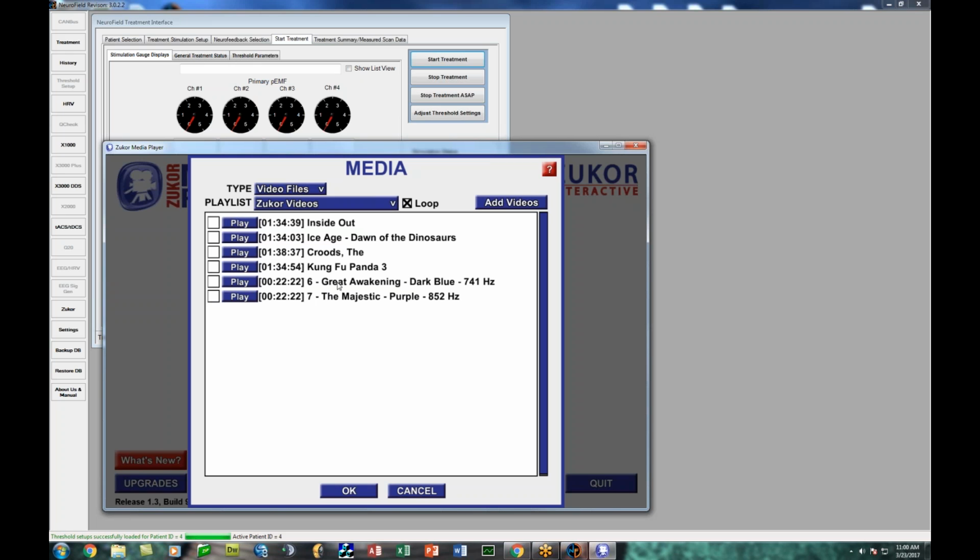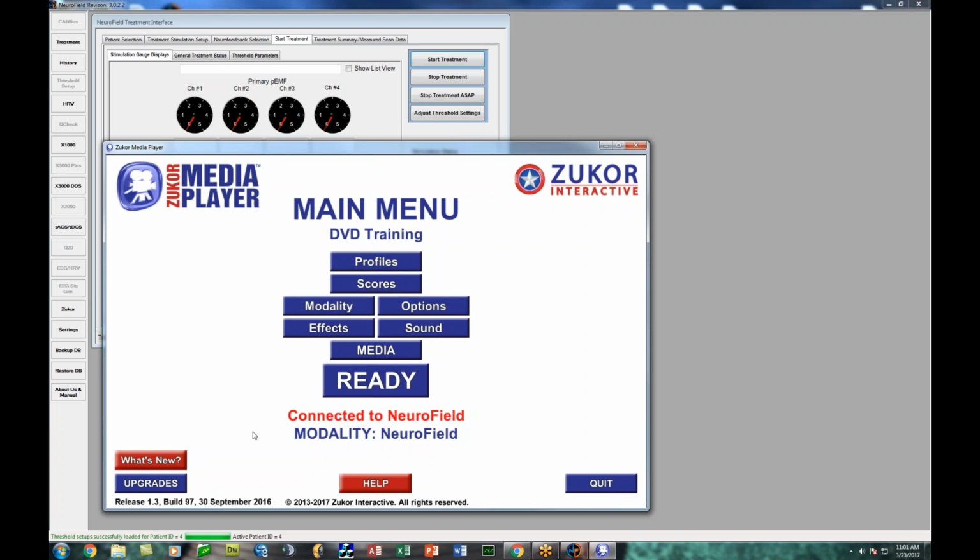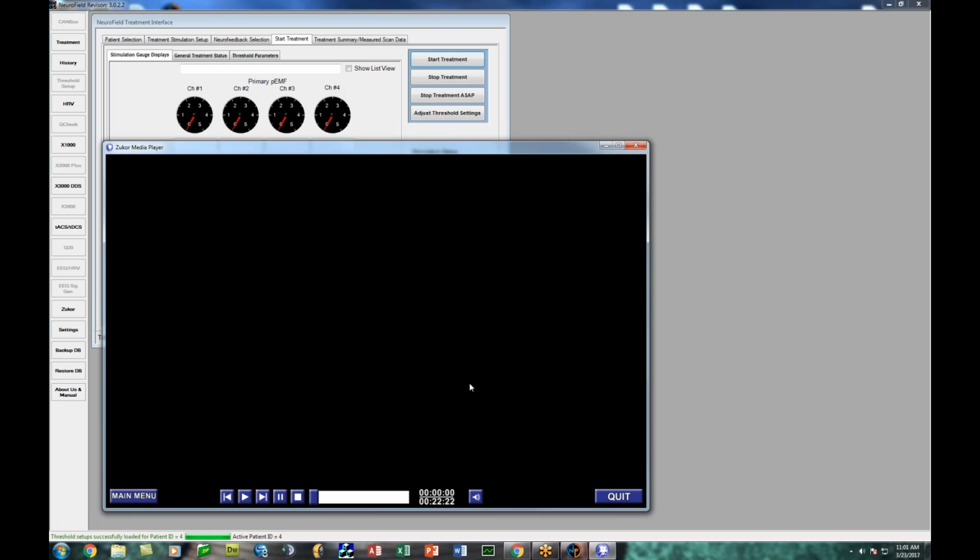You can go through and grab videos from our server, and it makes it really easy to make things play seamlessly. I'm just going to use the one that's here, this dark blue, and start that one up. Simply select it, say OK, and now we're going to say ready and get that started.